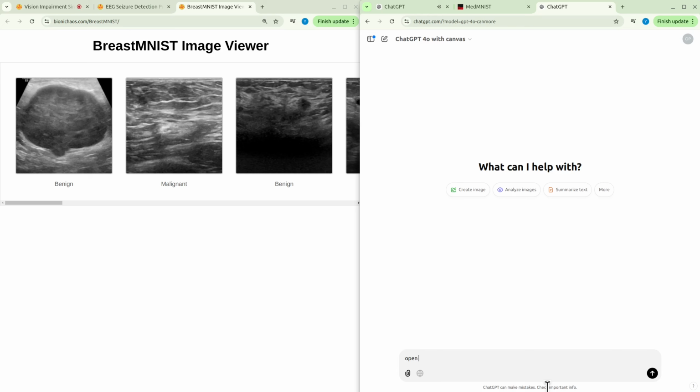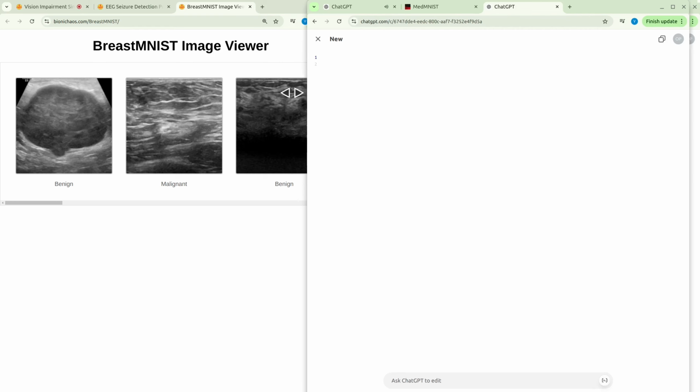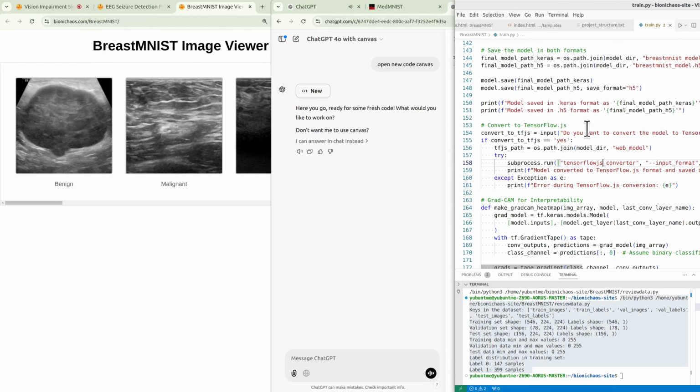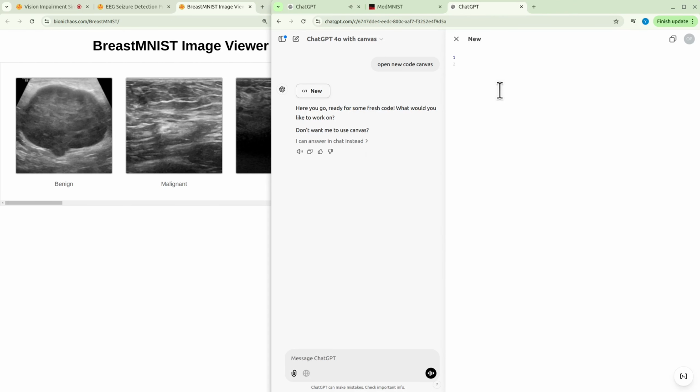2. Class imbalance handling. The code calculates class weights using compute class weight, which is good for balancing the loss function. Confirm these weights are passed correctly during training and review whether additional augmentation of the minority class might help further.